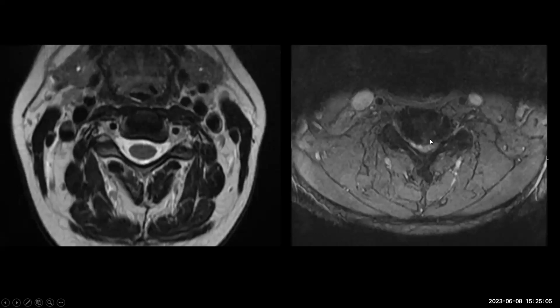Going on to that same case, when you see this, you can realize that the canal, the thecal sac, has been really flattened out, the cord has been compressed, and both the exiting neural foramina are severely narrowed. If you have a keen eye, you'll realize that normally the facet joints have good outlines, they're quite smooth. What's happening over here? Irregular outlines, bulky looking. So this stenosis is further aggravated by facet arthropathy in this particular case.